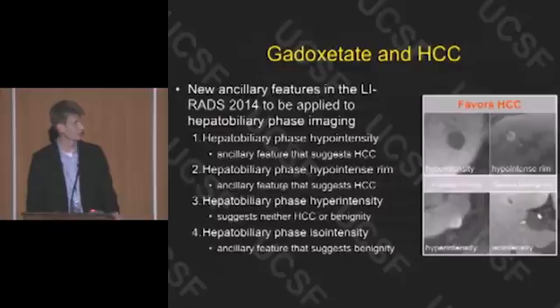Gadoxetate, EOVIST, and HCC. So we're about to come out with a new version of LIRADS, which is going to start including hepatobiliary agents in it. And I just want to go over a couple of findings.